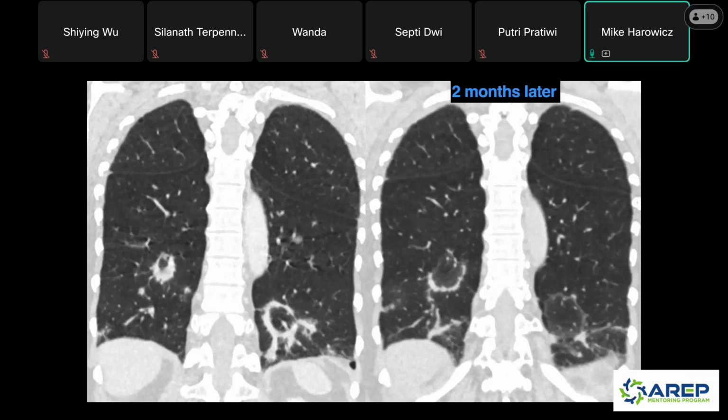So what are you thinking about with this patient, right? They have a history of cancer, so you always have to have your ears and your eyes up thinking about, could this be a MET or some sort of recurrence? Granted, this would be a MET in this case. But what are the other possibilities here? Do we think this is an infection? I'd say probably not, right? I didn't say it explicitly, but she's not having a cough. She doesn't have a fever. There's no sputum production or anything like that. No sick contacts recently. It's bilateral, so it's something affecting the lungs more globally.